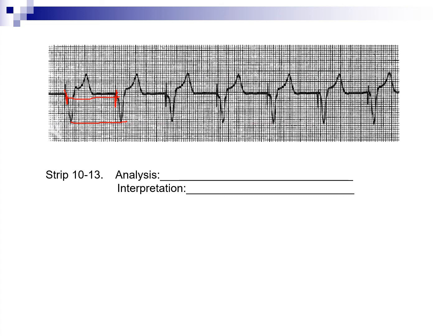Can we tell if it's sensing? Not really, because we don't see any of the patient's own beats. So the patient's own intrinsic rhythm would be below 60, so that's why the pacer is going faster than the patient's own beat. If the patient's own heart rate went up past 60, then it would kick in, where you would see one of the patient's own beats. But we can't tell if it's not sensing appropriately unless the patient's own beat is in there. But this is normal function, and the patient is 100% ventricular pacing.